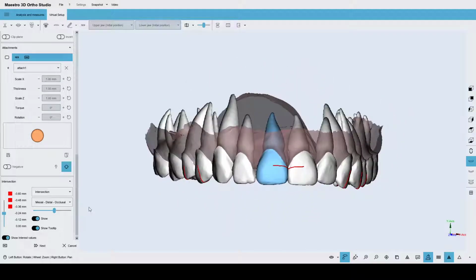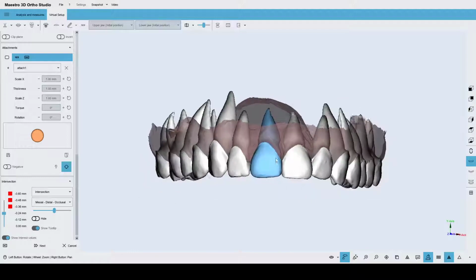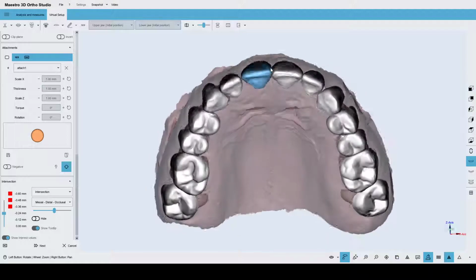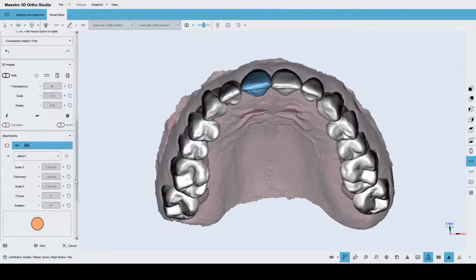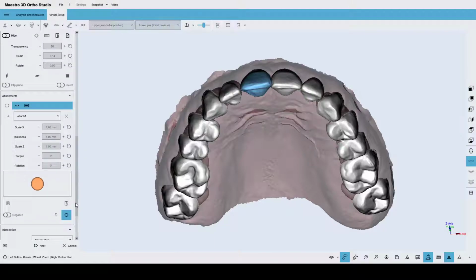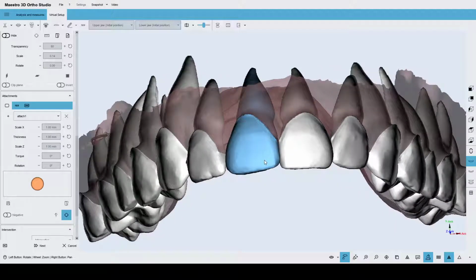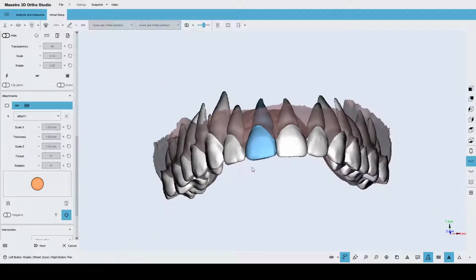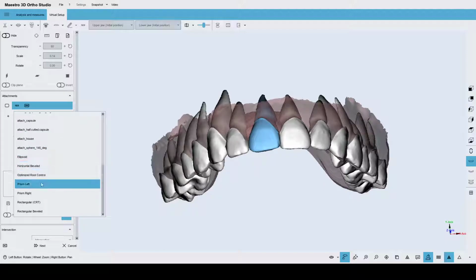Consider that another important thing that the software allows to do is to use the attachments. So in order to perform some kind of movements, I have the option now to put some attachments on my model. We have a library of attachments.